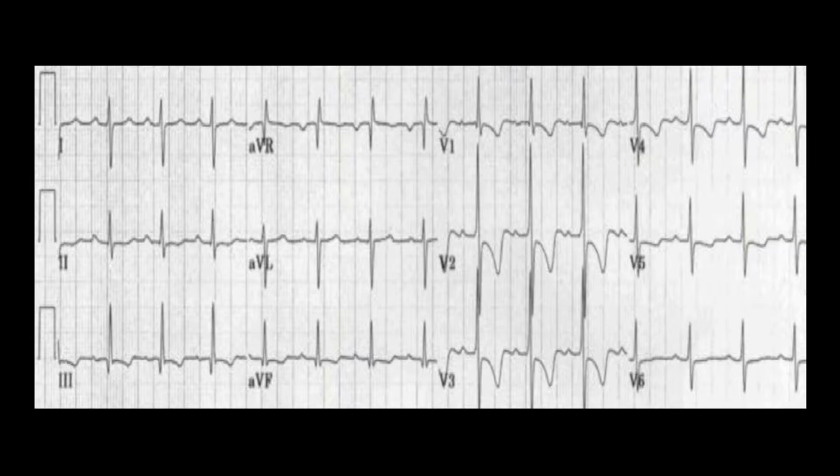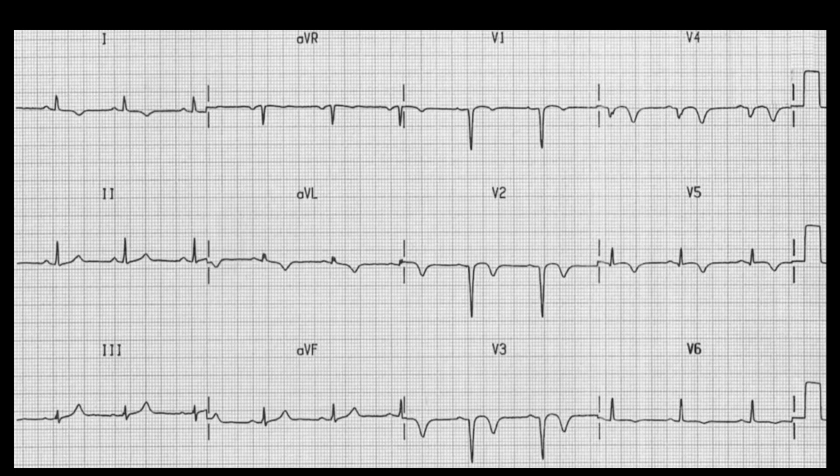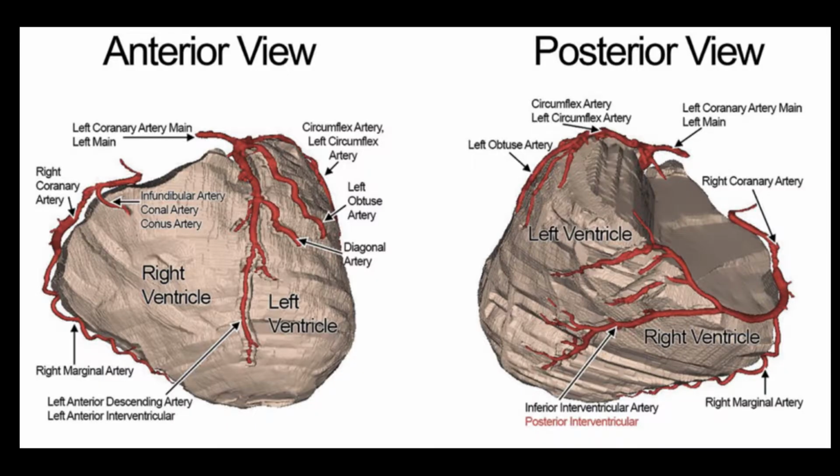If we have, for example, late R wave progression, whereas our previous example was early progression, this could also indicate three potential causes: left ventricular hypertrophy, left bundle branch block, and a possible anterior MI with late R wave progression, as you can see in the example here. So let's take a quick look at the coronary artery anatomy.